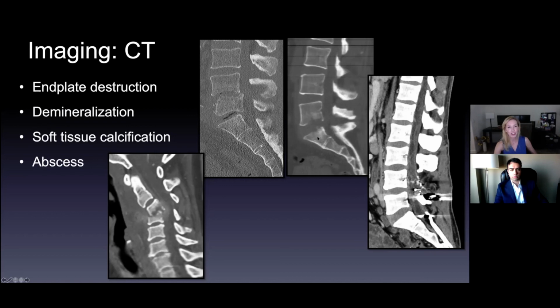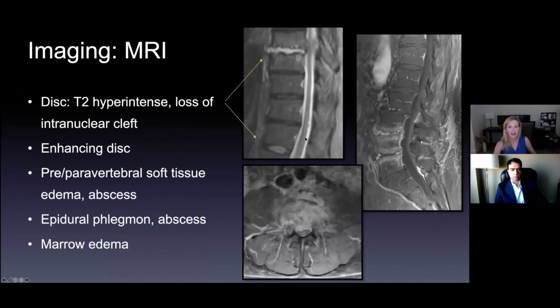When we see more degeneration, I don't know if you're going to see that at the end of this seminar or not. It doesn't quite have this appearance, but look for this on your CT if you can't get an MRI. And then, this is what the MRI, this is optimum if you can get it. So when you have discitis osteomyelitis, this is the T2, the cerebrospinal fluid around the spinal cord is bright, so it's a T2 weighted image. Your discs are probably going to be very bright if they're infected, like this, very watery looking, very bright.